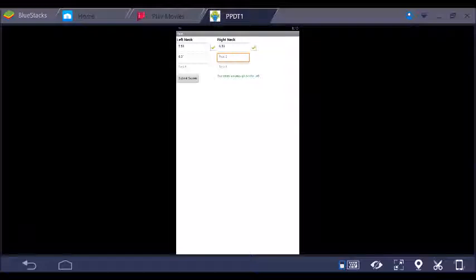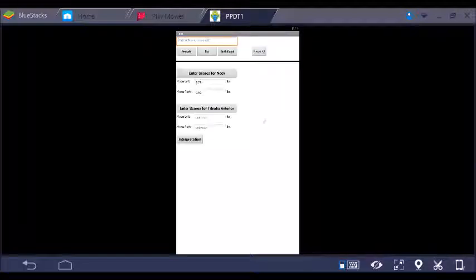But let's come up with a different example. Let's imagine on the right side we get 10.67 pounds. When I tab off of that, it's going to say, well, that difference is bigger than what we know of the standard error, so you should do another test on the right side. So let's go over to the right side, and let's say we do 9.85 pounds. Okay, so now they're all sort of within a couple of pounds. Then I can submit the scores, and here you'll see that the app has calculated the mean for me.